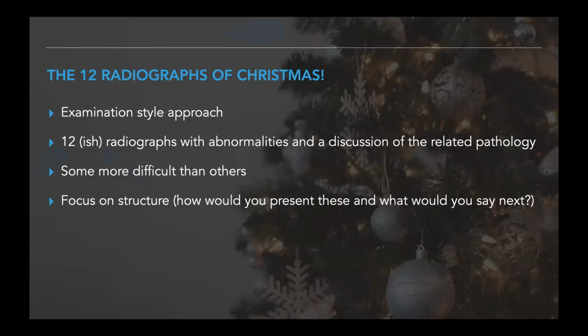So, keeping it festive themed, I've done the 12-ish radiographs of Christmas. Each of them have an abnormality, and we'll discuss what the abnormality is and the related pathology. Some are more difficult than others. I don't expect you to get all of the answers, but what I want you to do is, while we're going through them, try and focus on your own structure. So if you saw this in an exam, how would you present it? What would you say next? Put yourself in the position of a student being examined in finals.